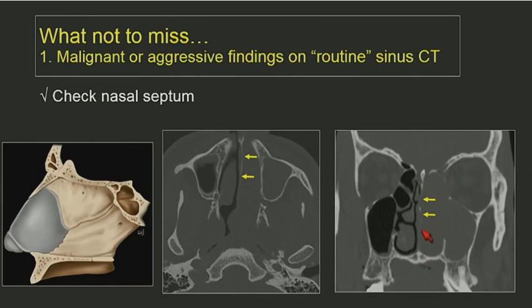The septum has multiple areas of destruction, and the tumor is now in the right nasal cavity. And look at the anterior skull base. The normal cribriform plate here on the right is destroyed on the left. This thin bone, the lateral lamella, has completely been destroyed, and there are multiple areas of destruction of the ethmoid roof.